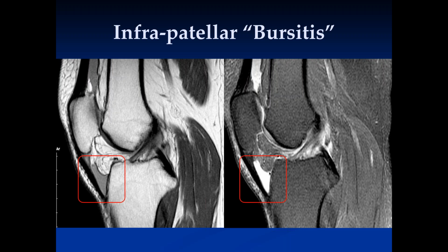If you look at the skin anterior to the patellar tendon, it looks like that area has been aggravated, probably in a chronic fashion, kneeling or whatever. But that doesn't look normal, does it, John? It does look like there may be a little bit of edema. It is very common to get chronic fibrosis in the subcutaneous tissues anterior to the patella and the patellar tendon. And as you say, it's probably because of chronic kneeling injury over the years. Yep.